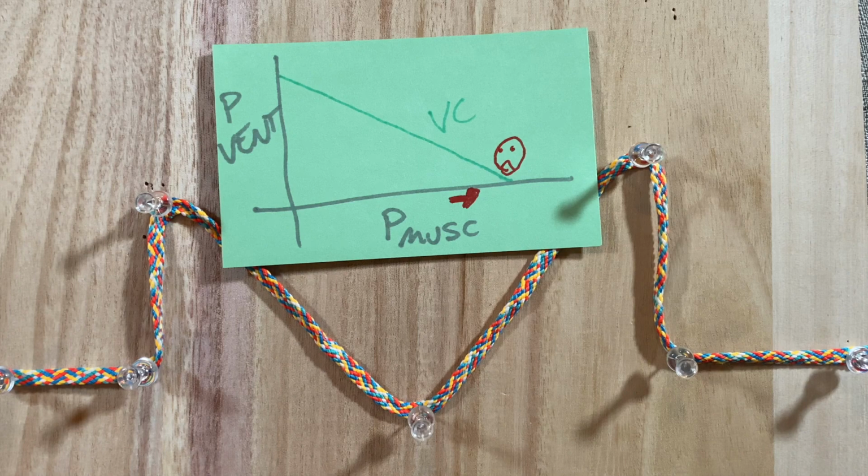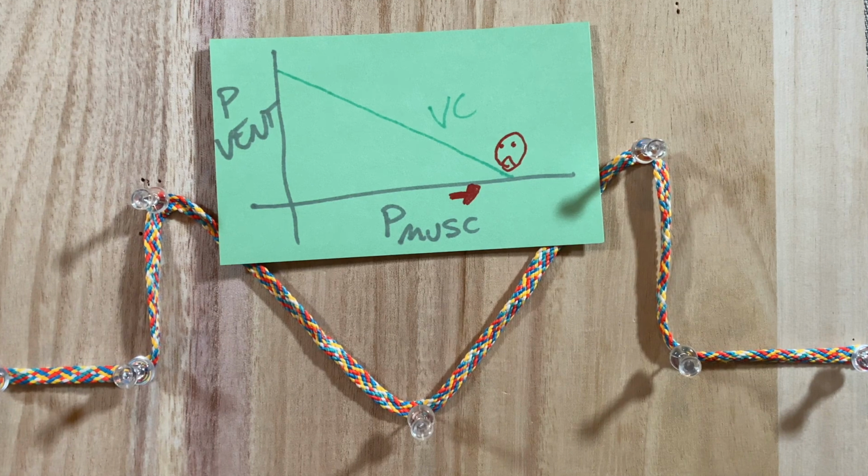In volume control ventilation or in PRVC ventilation, the higher the patient demand for breath is, the lower the amount of support they'll receive from the ventilator. In patients who are very sick with ARDS or metabolic acidosis, this is dangerous, and this needs to be amended somehow. And it's up to you as a treating clinician to decide how.